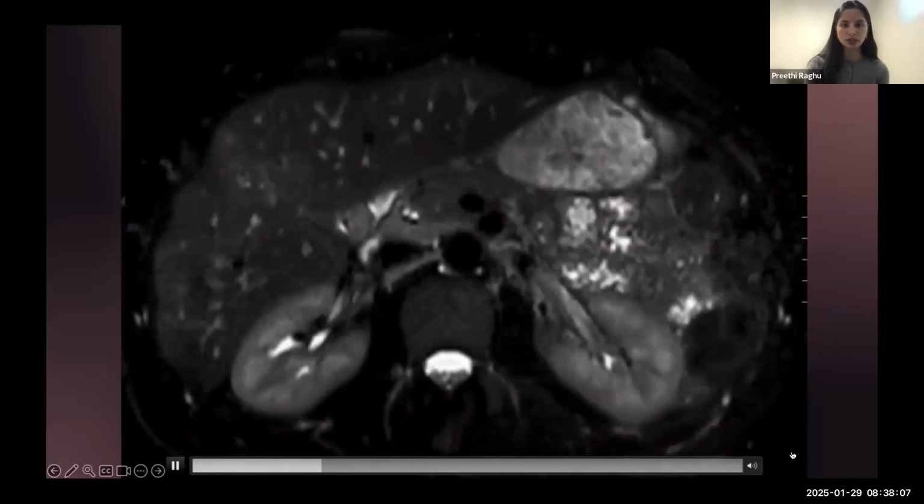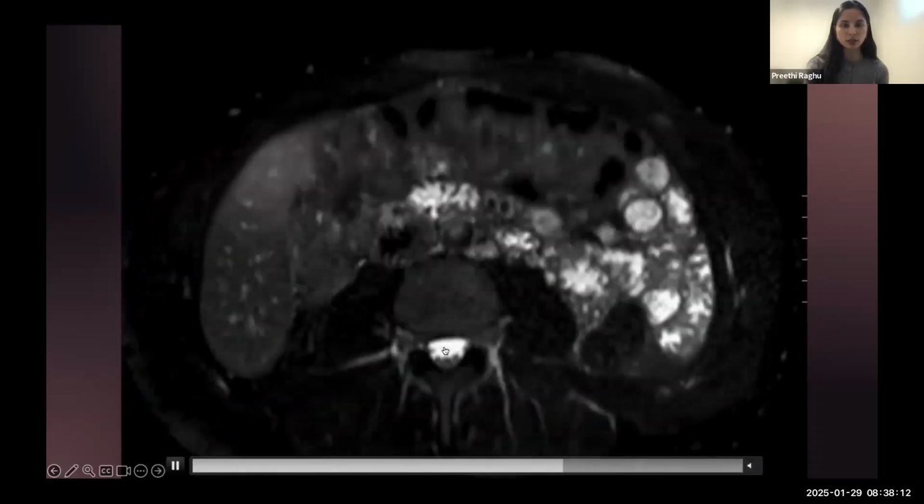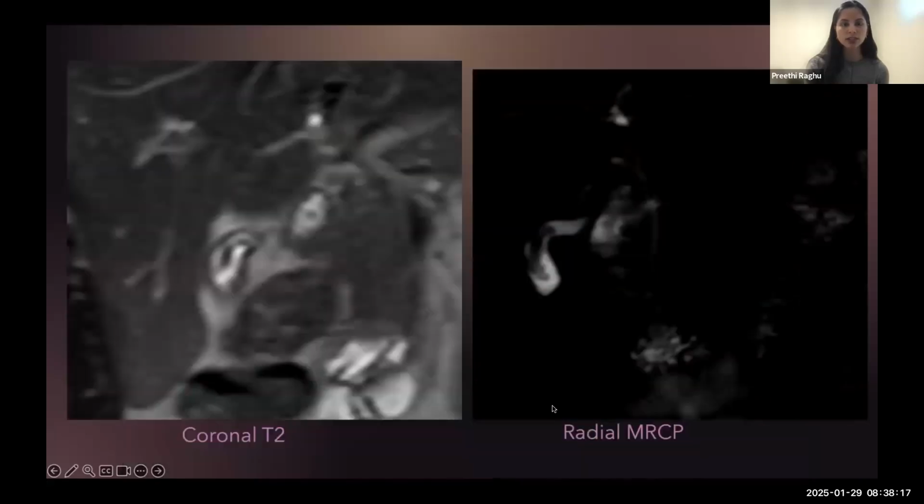So I'll just show this MRI, and it's T2 weighted, and you could see that there's something in the gallbladder, which initially was called a septate gallbladder, which is a variant you can have. But on the T2 and on these MRCP images, it looks awfully curvilinear, and was corresponding to that gallbladder ultrasound finding where it was in a different configuration, which gallbladder should just stay the same.